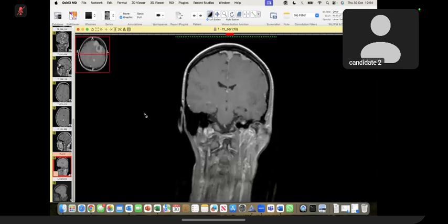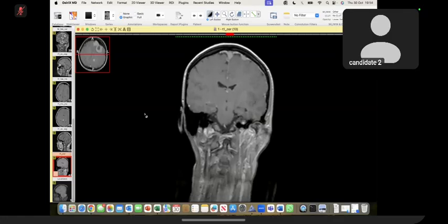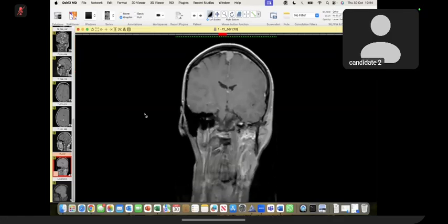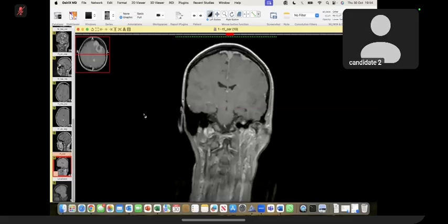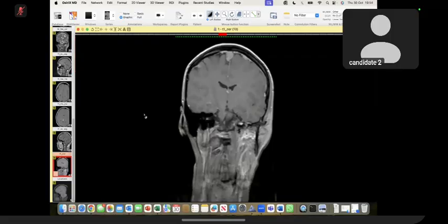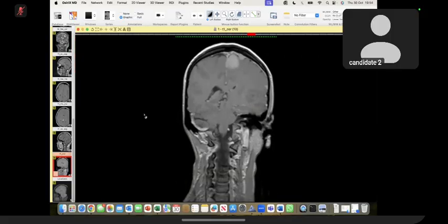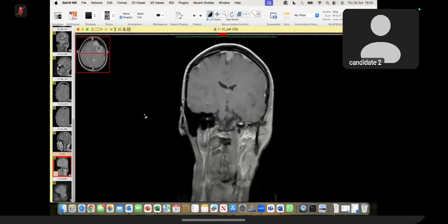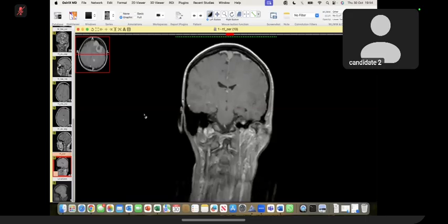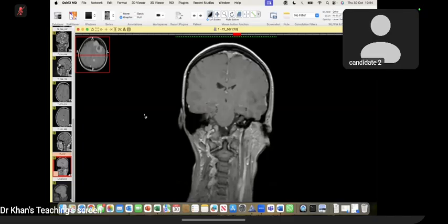I would like to convey my findings to the referring physician and request them to get a whole neural axis imaging to look for multiplicity of the lesions, including the spinal tumors as well. The patient needs genetic screening, and the further management depends upon the symptoms, because there are multiple, and if the patient is developing any symptom relevant to these larger ones, neurosurgical consult is suggested. I could not appreciate any obstruction, no transtentorial herniation, or any signs of acute hydrocephalus.